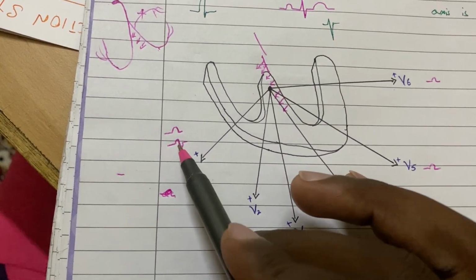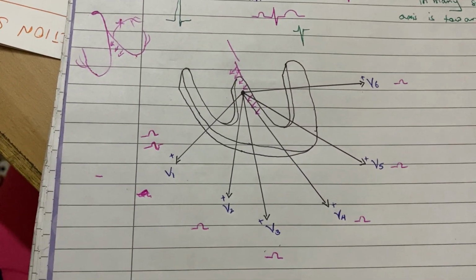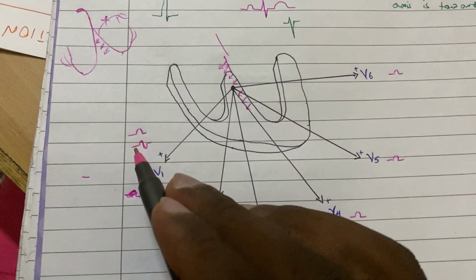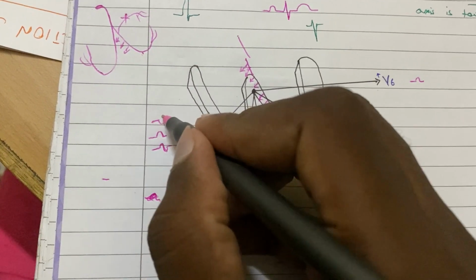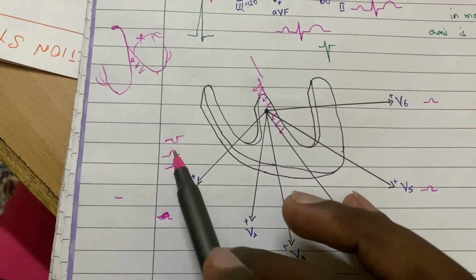You can see it like this or like this; if it is not above the limits we gave, it is normal. But if it is above the limits, it is abnormal. Also, if it is purely negative like this, that is abnormal. At least it is this or this.